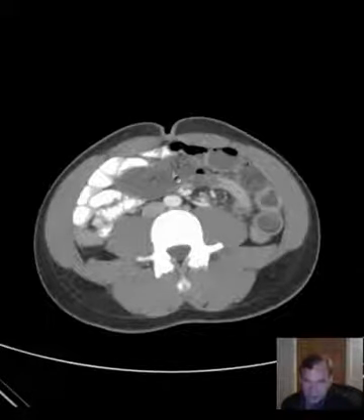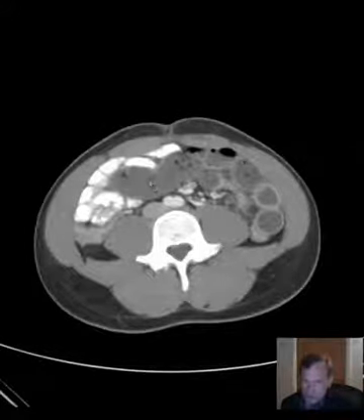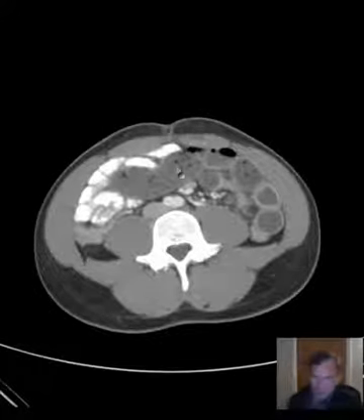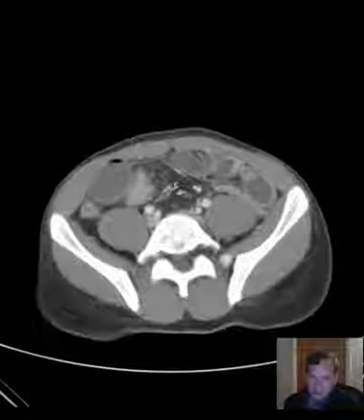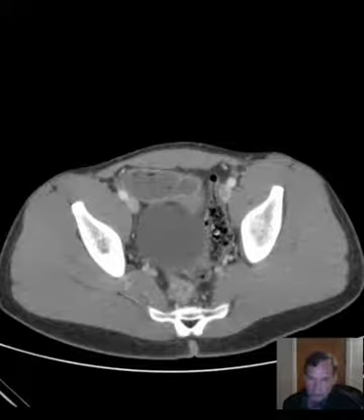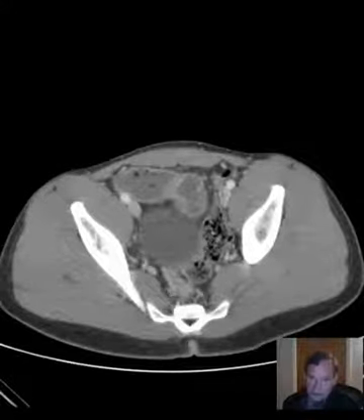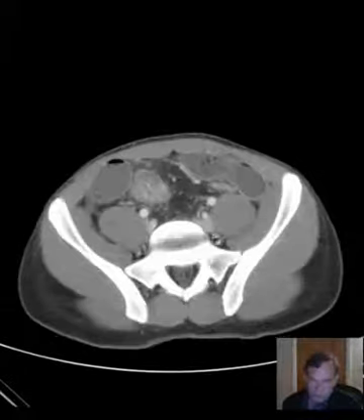is a small bowel obstruction, and the backup of material in the small bowel allows it to get sufficiently deprived of fluid from the fluid absorption in the small bowel that you acquire this small bowel stool sign. Remember, normally we see stool like this, as we have it here in this case, in the sigmoid colon. And very often we'll have it throughout the colon.